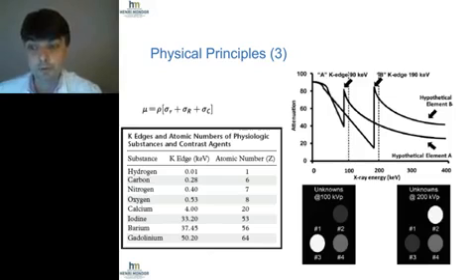If we look at those four different tubes, and look at, for example, tube number 2, if we want to define which materials are composed within tube number 2, we could imagine that tube number 2 is actually a composite of two materials, material A and material B. If we know the attenuation profile of material A and material B exposed to different energy levels, we can reconstruct the atomic composition of tube number 2 as a composition of material A and material B. Why is that? Because material A and material B do not have exactly the same attenuation profile.